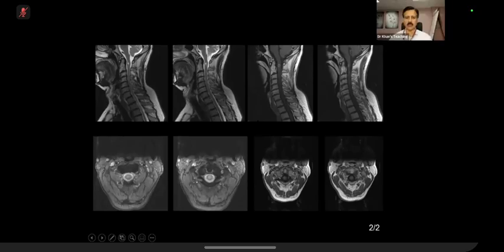So you give contrast. Now, once you give contrast, then comes the question, is it demyelination versus, let's say, a tumor? So please remember, in the real world, many a time you are not very sure. So if you see some associated finding in the brain, etc., or let's say the optic nerve, etc., then you go for demyelination. But at times, follow-up scanning and things like that will give you the answer. But having said that, early demyelination will not have this cystic type of component. And you can see there is a subtle enhancement and there is nodularity there.